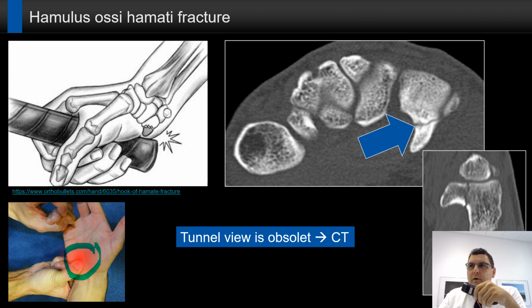It's not so uncommon that these fractures are also diagnosed as a side finding in MRI for people who do not recover after trauma. I have seen a lot of first-line diagnoses on MRI in these cases because nobody thinks about the fracture of the hamulus.